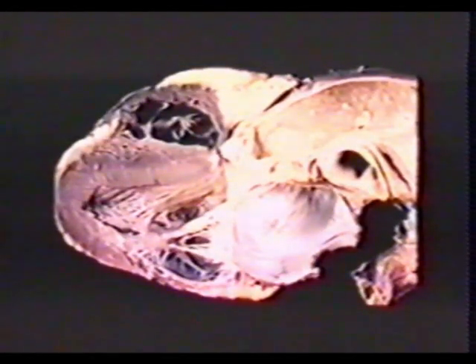Regions of chronic infarction become thinned and fibrotic, and therefore well demarcated from adjacent normal myocardium. This pathologic specimen has been sectioned in long axis. This patient had an old inferolateral infarct involving the basal and mid-levels. Note how easy it is to identify the chronic infarct because of the thinning.